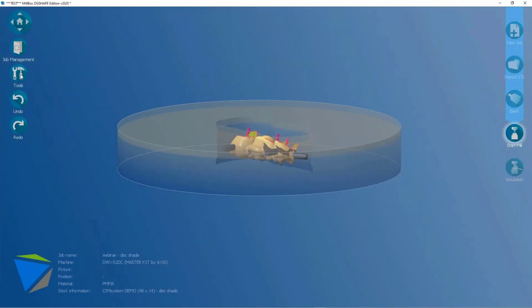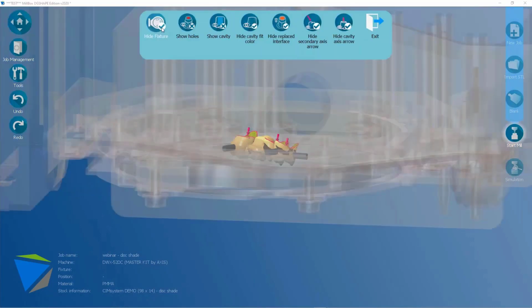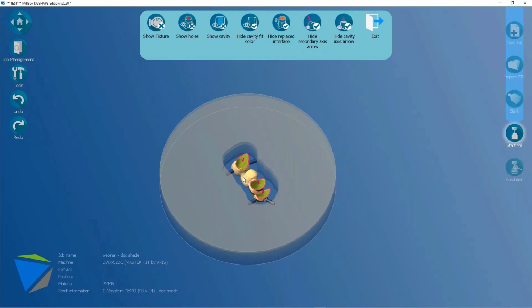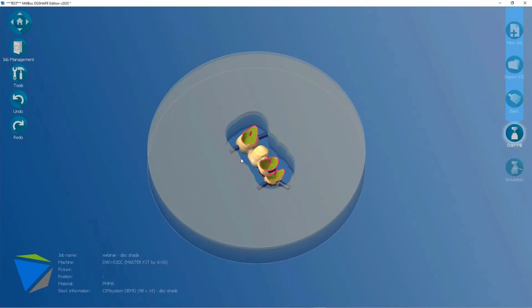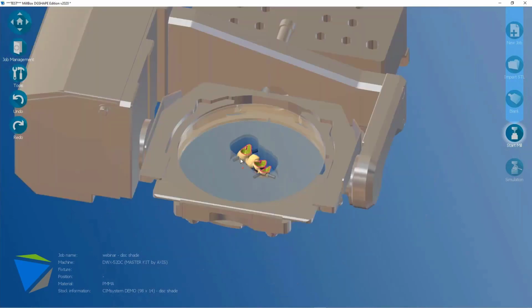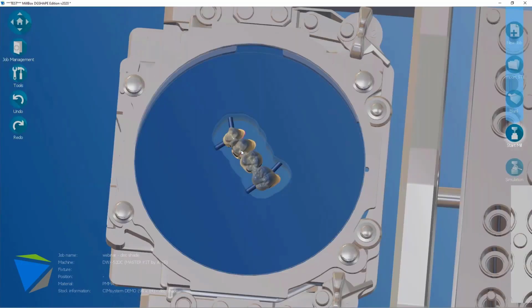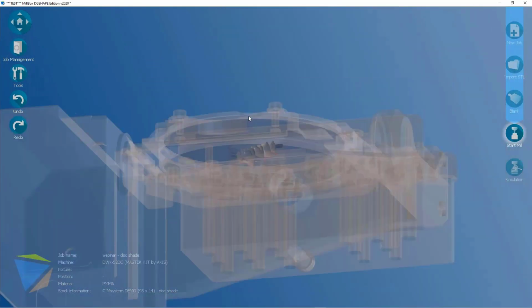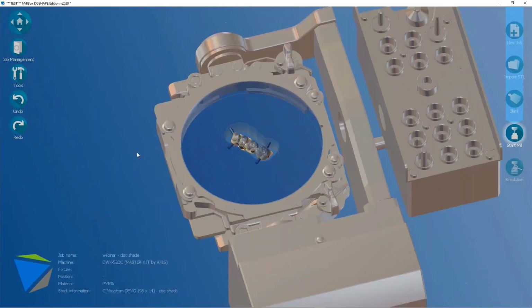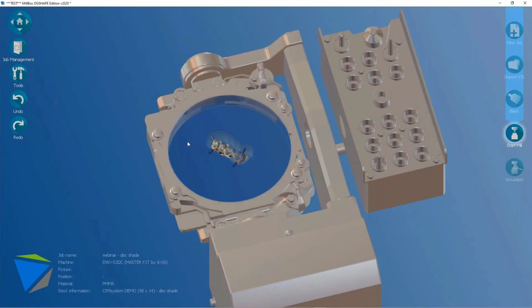How? Of course, thanks to this command I have show picture, hide picture. But as we are working in Windows, we have some hotkeys that we can use. For example, Control E, like the equipment, you can turn the equipment off and on. There are other special functions, for example F5. F5 is top view, XY, or lateral, or frontal, or perspective, or the command with F9 that can tilt the 4-axis, for example, even by using the keyboard.